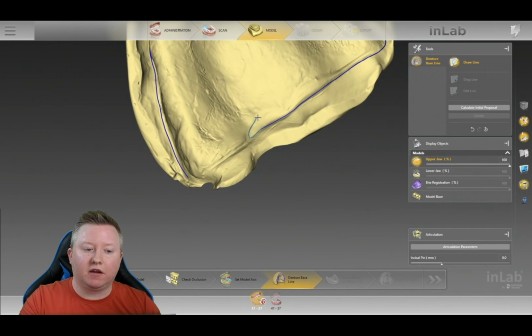If you make a mistake, like I just did, we can right click that, and we're going to go back. Always going to go back. And it'll only go back to the next left click that you had produced. And then when we get to the end, it's automatically going to connect it together. With that connection, we're just going to do a double click.